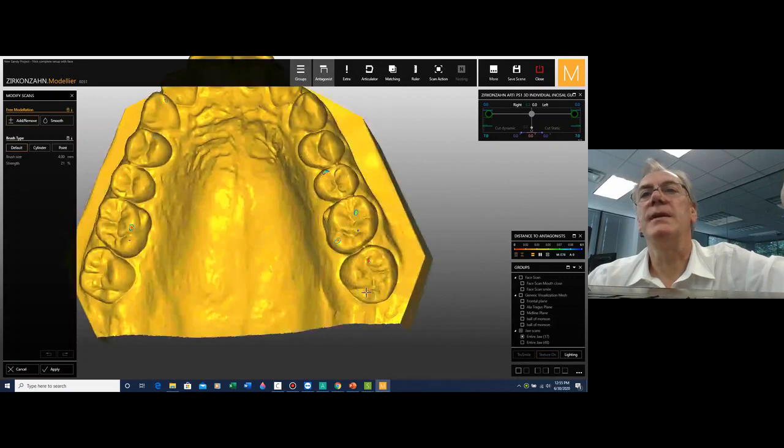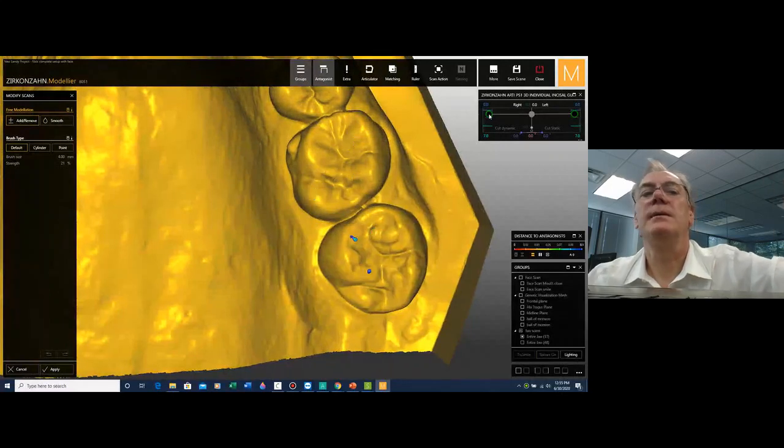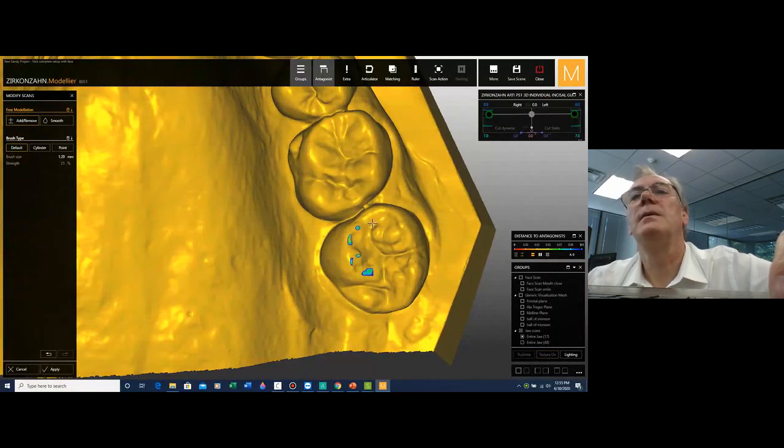Yeah, it's a little bit slow today. We need a little bit of patience. So let's go. 1. I'm going to make this smaller. Go 1 more.